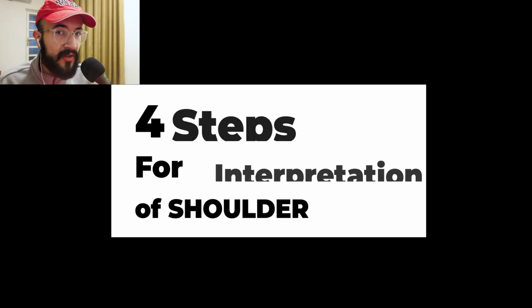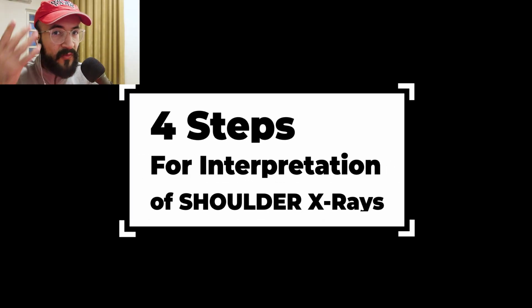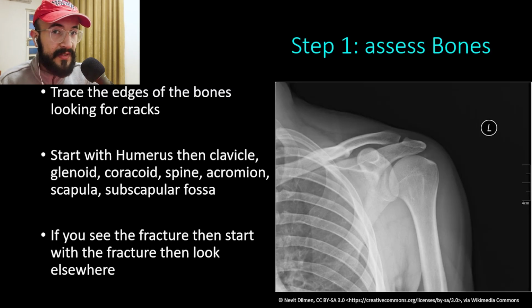In this video, we will talk about 4 steps for the interpretation of a shoulder X-rays. So starting with step 1. In step 1, we assess the bones of the shoulder. So we trace the edges of the bones looking for cracks. As you can see in this anterior-posterior shoulder X-rays, we start by tracing the edges of the bones.